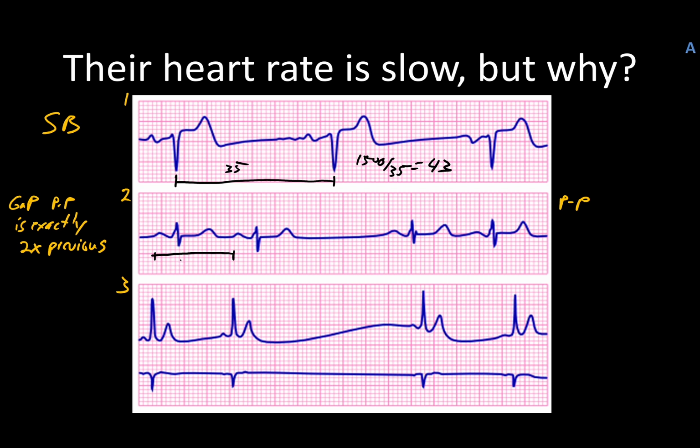So for that we get 17. And then if we measure, and I realize this one slopes up a little bit through here, but I think our most definitive start point's about here. And this gives us a distance of 34 small boxes. So we wind up with double, because 17 times 2 is 34, which is exactly what we were looking for.